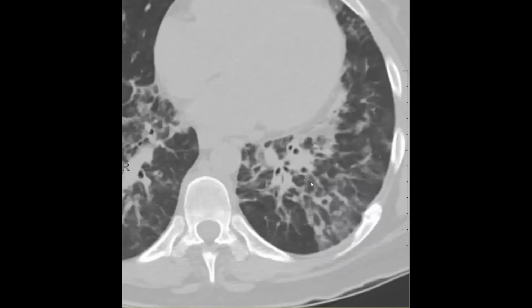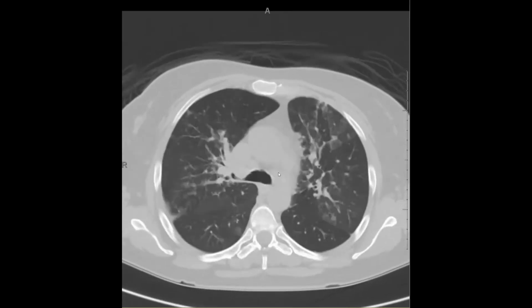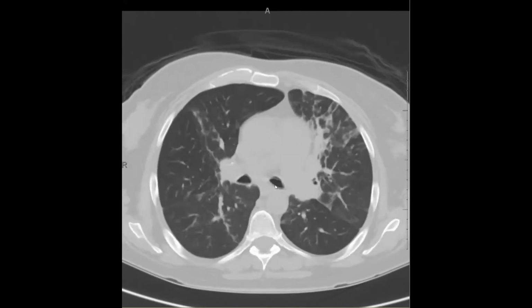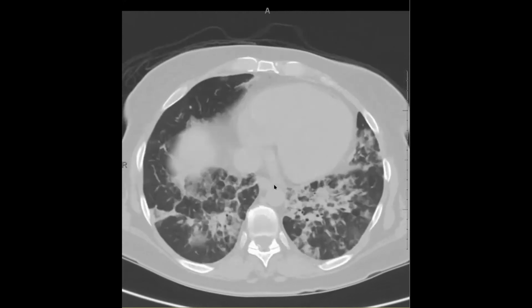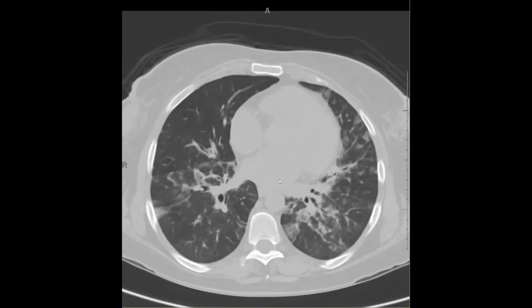And we know that in the setting of a perilobular consolidation pattern, one of the first things that we think about is organizing pneumonia. So that's what I thought this was going to be. Believe it or not, this actually turned out to be eosinophilic pneumonia. And so I don't think that we're wrong here, because eosinophilic pneumonia certainly could have components of organizing pneumonia. And so some people think that they are essentially cousins. They maybe are same spectrums of inflammatory disease, but this is clearly eosinophilic predominant.